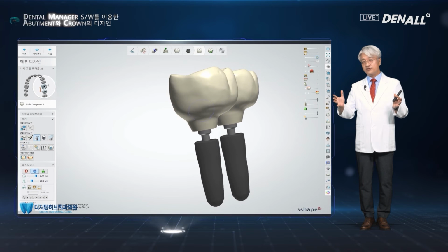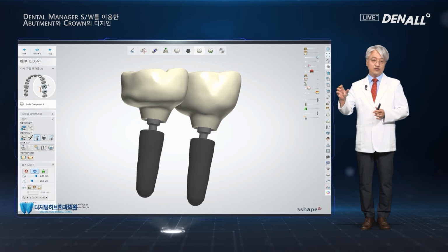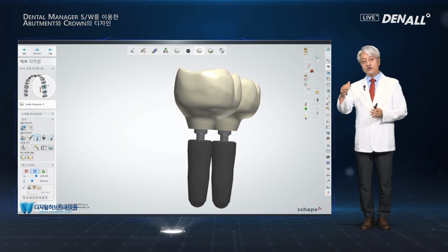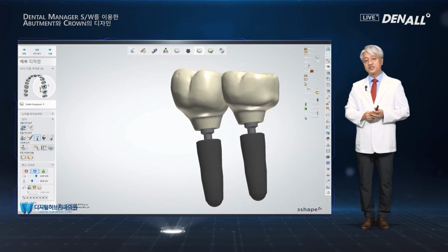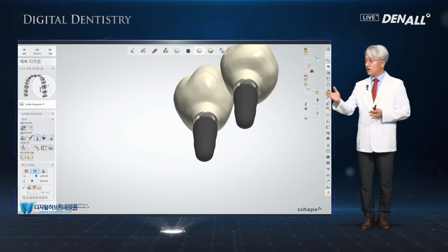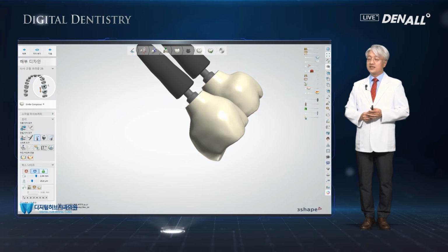When the final prosthesis is delivered, the health needs to be maintained for a long time through emergence profile or soft tissue support. The health is also dependent on the boundary between the crown and gingiva, so all these things need to be considered before moving on to the finishing stage.